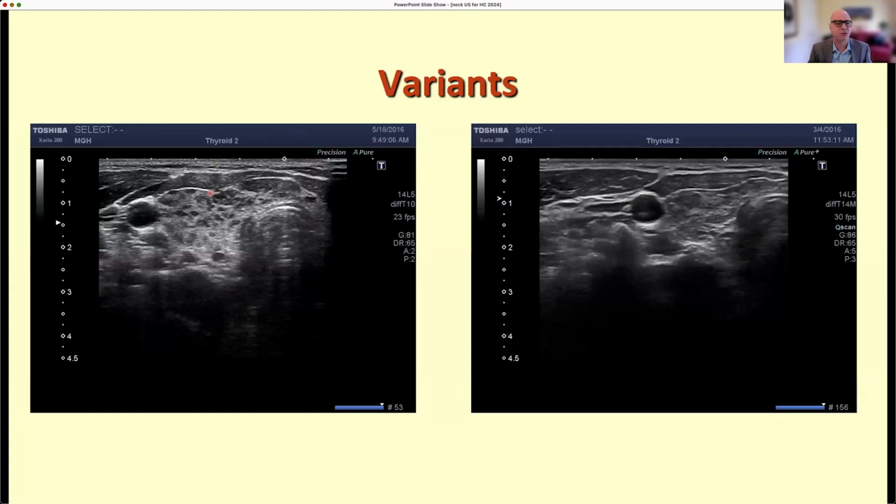And as I mentioned to you, it can be patchy. For example, here you see most of the thyroid still has the typical normal granular texture, but you can see several areas of hypoechoic tissue, and this is very typical of either Graves' disease or Hashimoto's thyroiditis. If you look at this under the microscope, you basically see a lymphocytic structure here and a follicular structure in this area.